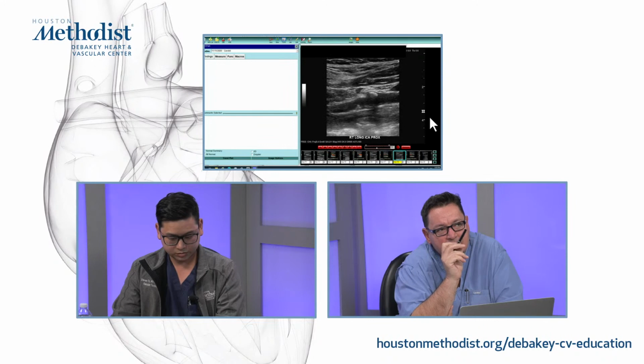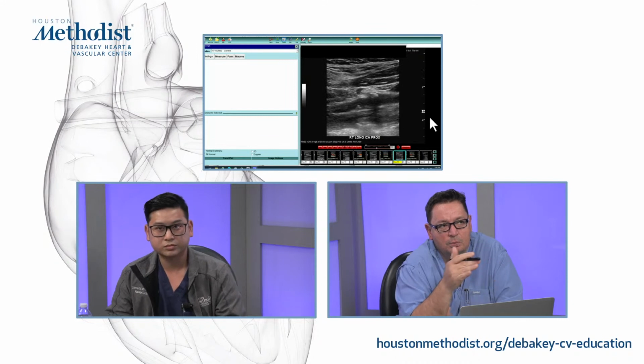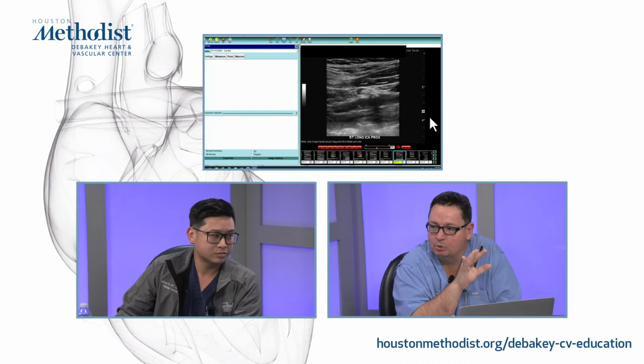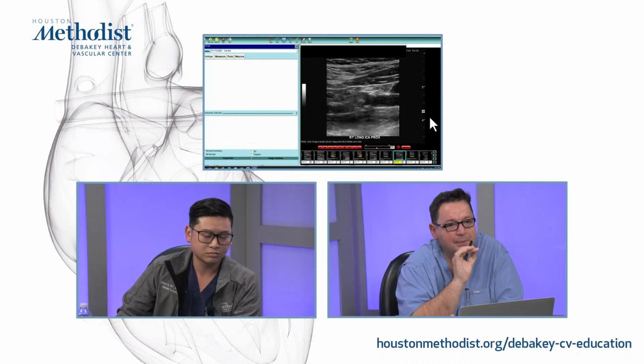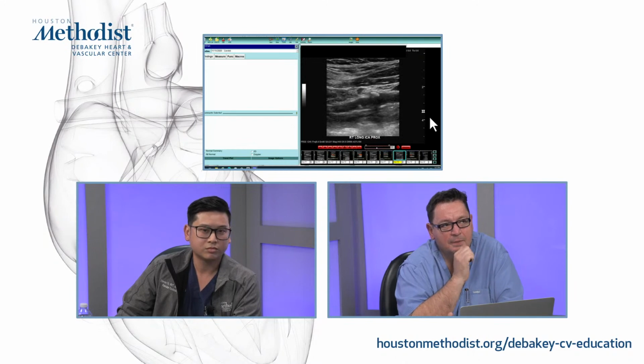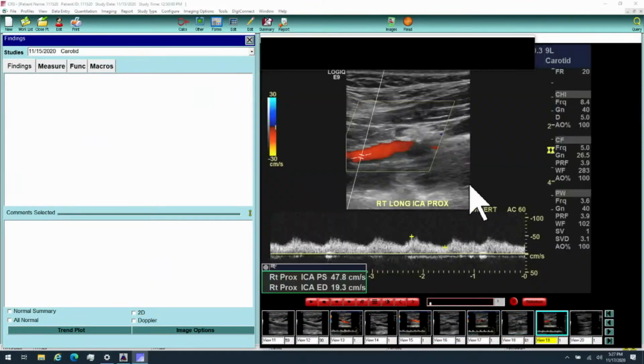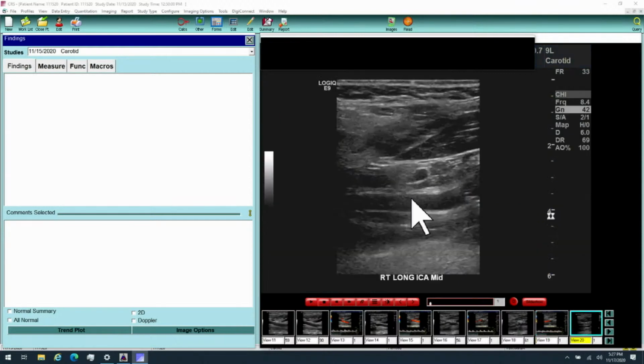So despite it, I see the grayscale, but I'm missing the color box. I'm also missing more proximal measurement throughout that area where you really see the plaque. I think that was a beautiful waveform after the plaque, but I really wanted to see some measurement in the proximal ICA area. Right, when you see plaque like that, you really should try to attack the area where a majority of the plaque is. Yeah, but seeing the waveform completely changed from the distal CCA and a fair amount of difference in the ECA, you would be suspicious of a high-grade stenosis at that particular area. Yep.